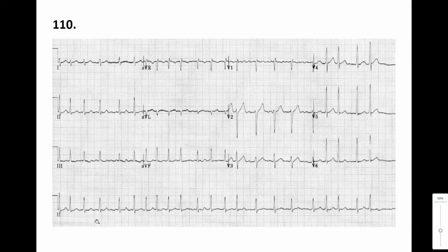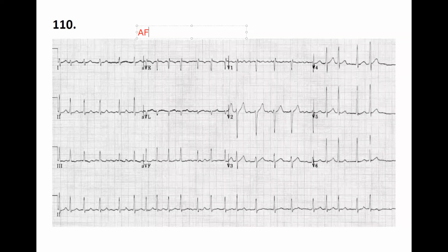Arrhythmia. You said arrhythmia absoluta. No P wave. So atrial fibrillation. Let's keep in your mind: arrhythmia, no P wave, or if you do see some P waves or what looks like a P wave, it's irregular. Irregular waves mean atrial fibrillation.